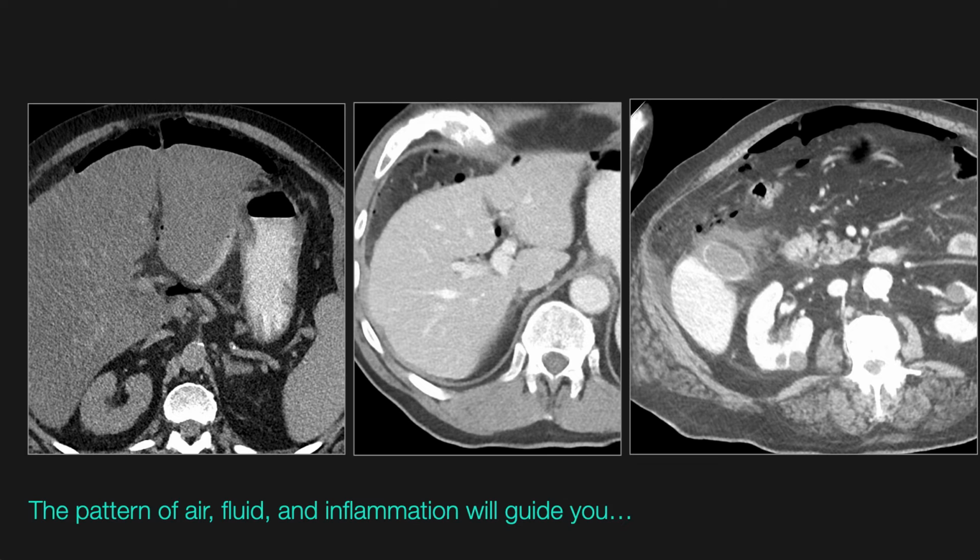For gastric, pyloric, and proximal duodenal ulcers, you will see a characteristic pattern of free air in many cases. You'll see air in the anterior abdomen, in front of the liver, in and around the gallbladder fossa, and there is often associated fluid. You may not always see the ulcer crater, as it becomes small after it decompresses and perforates, and the surrounding edema often presses it together, making it hard to see, but the pattern of air, fluid, and inflammation will help to guide you.